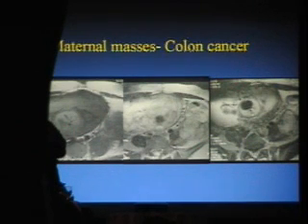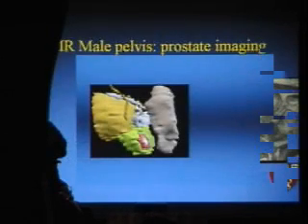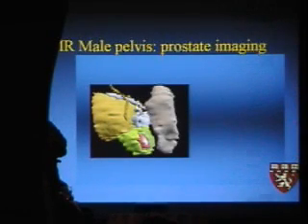The less happy story, unfortunately, where a patient presented with multiple episodes of abnormal GI bleeding, blood per rectum, and cramping during pregnancy, thought to be diverticulitis for a while. Ultrasound saw a mass in the left flank, wasn't sure if it was related to the uterus or the baby. MRI confirmed it was not, and unfortunately it was a large invasive colon cancer going back here into the psoas muscles. Okay, so we're going to change gears for the last 15 minutes or so.